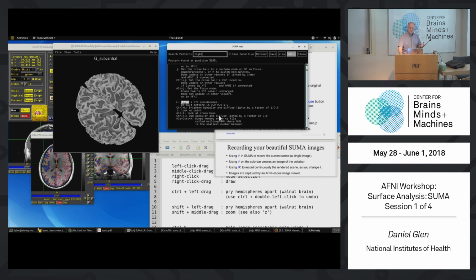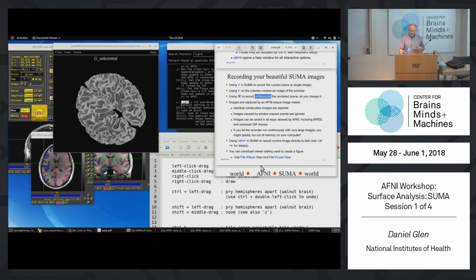To make all my changes before, I have to add the .summarc. Yes, .summarc controls those things. There's a bunch of settings for light. If you need more light, I can turn on a light for you. It's not just a switch, though. It's actually code. Oh yeah, I'm going to get to that. I think it's next on the list.